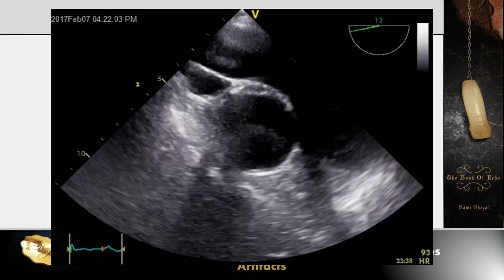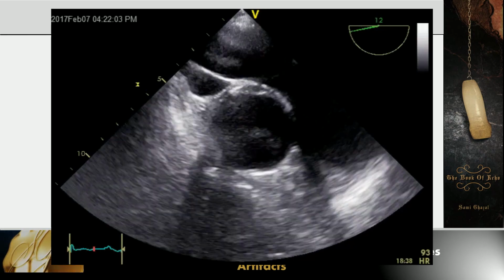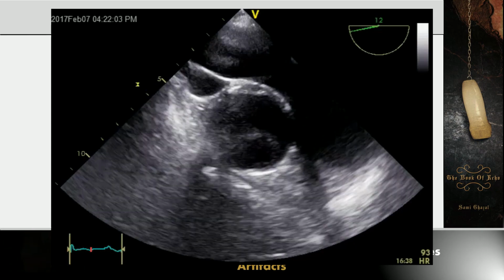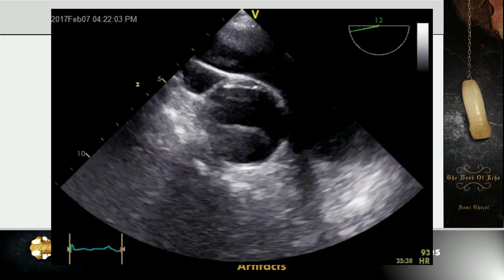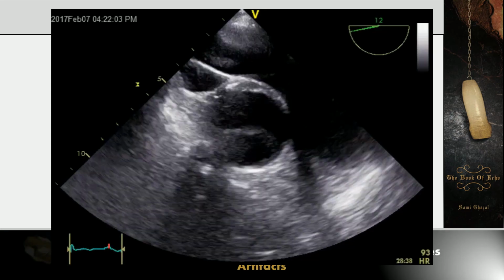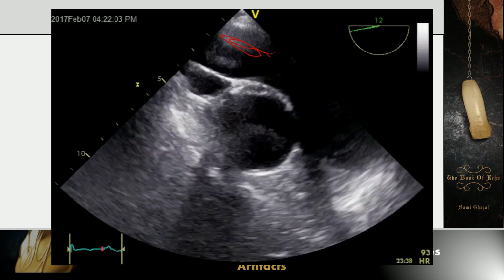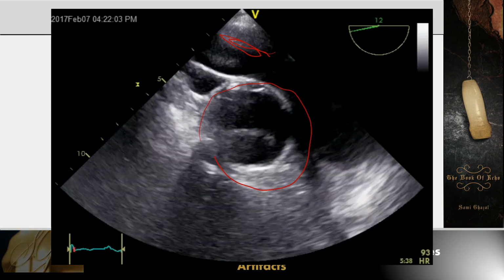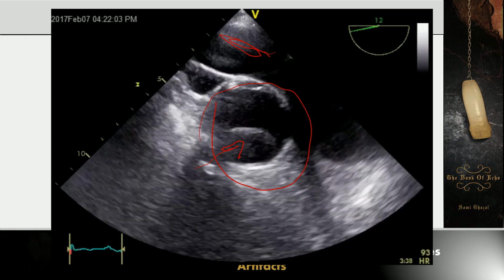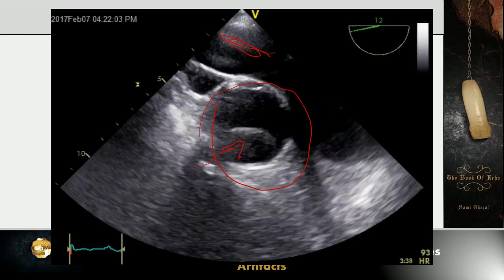We'll start by showing you this case. Think of this image. This is a transesophageal video that is showing the ascending aorta and the pulmonary artery. So this is the right pulmonary artery here. This is the ascending aorta here, and we have the structure here in the lumen that we're not sure is this a dissection or is it an artifact.